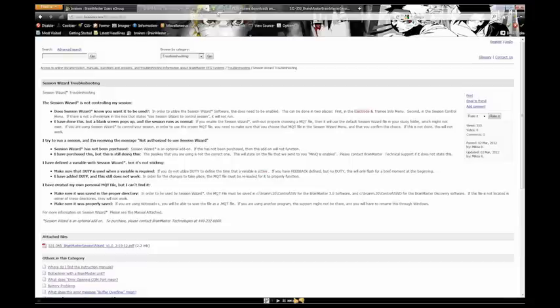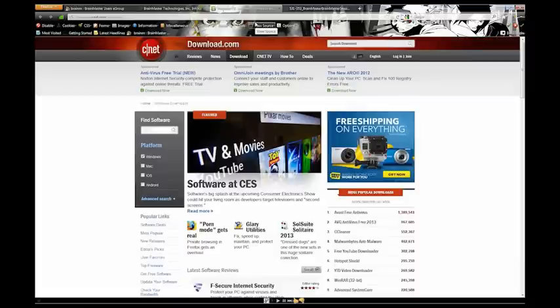Now that you know some of the different resources, the final resource I want anybody who works with any type of SessionWizard file to have is a program called Notepad++. It's an advanced Notepad program that allows you to edit, create, and save SessionWizard files. We do have editing built into the BrainMaster 3.0 Discovery and BrainAvatar software, but personally I edit outside of the software, and then run it and edit outside again. So I recommend anybody who does this downloads Notepad++.